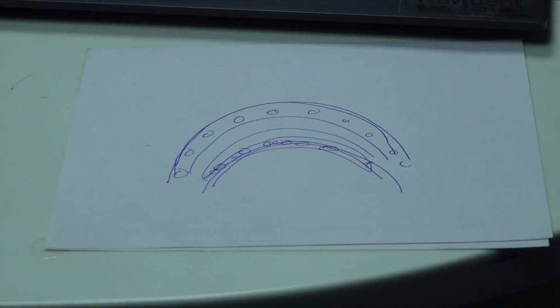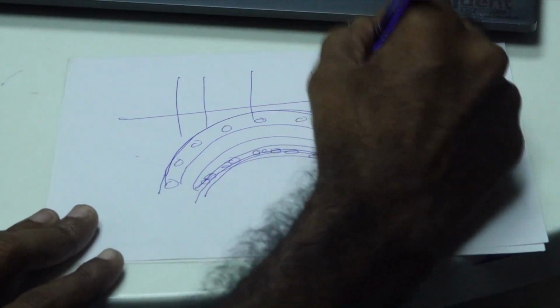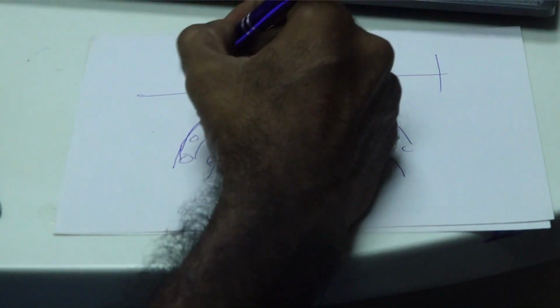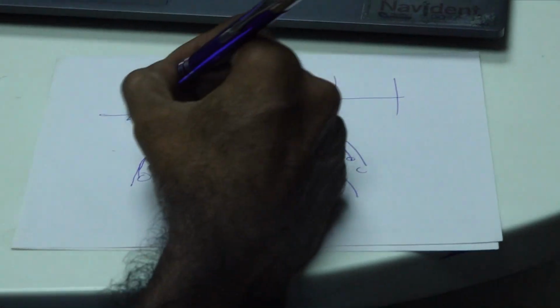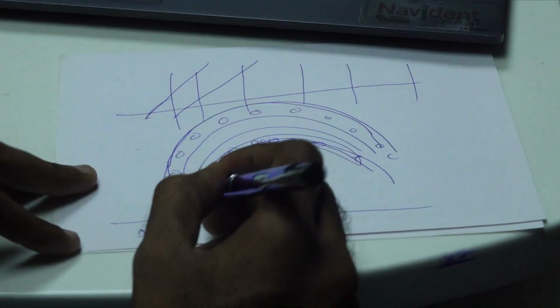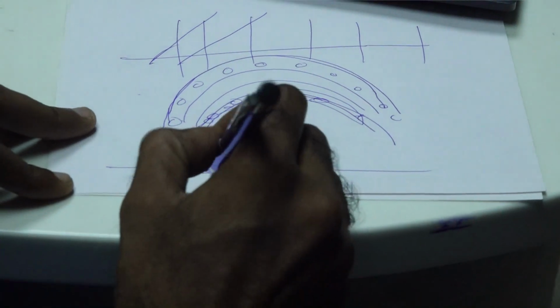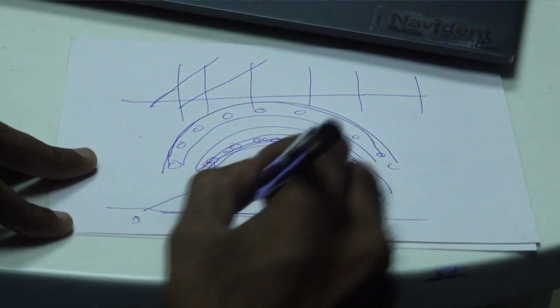This we should plan. The general rule is, if you place all implants straight, you can increase the number of implants. But if you place tilted implants in the 5 region, you are encroaching this space. You cannot place in the 4 region a straight implant, so this 4 area is knocked out unless you again place a tilted implant.